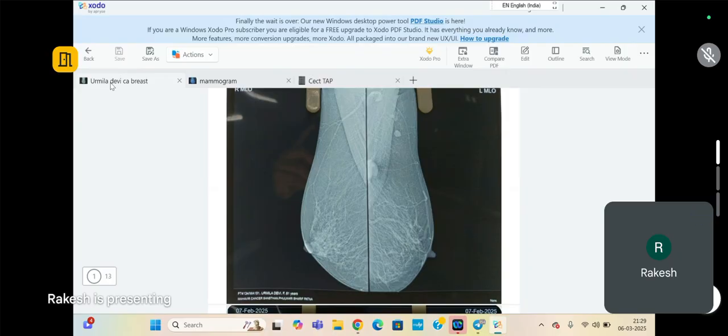Is it related to the elasticity of the lesion being lost? So that's why when the probe is kept, it seems taller. So it is the compressibility of the lesion. Elasticity also, that is one way of expressing it. So the more malignant the lesion is, the less elastic or less compressible it is. So they'll look taller than wider, whereas benign lesions are more compressible, so they'll look wider than taller.